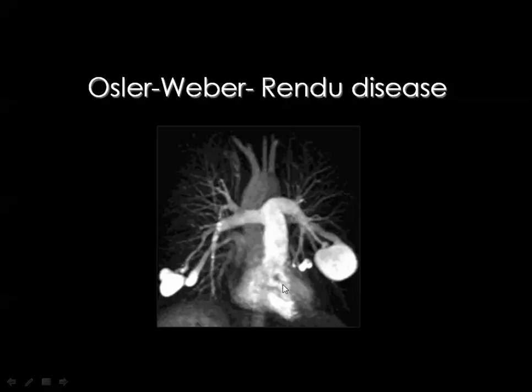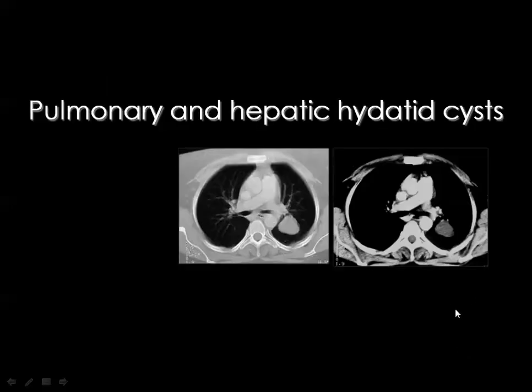It is performed using the motion of the blood in the vessels. Then you see a big arteriovenous malformation here with a smaller one nearby, and there is also a big one, and you see this is the feeding artery and this is the draining vein. Multiple arteriovenous malformations are suggestive of Osler-Weber-Rendu disease.